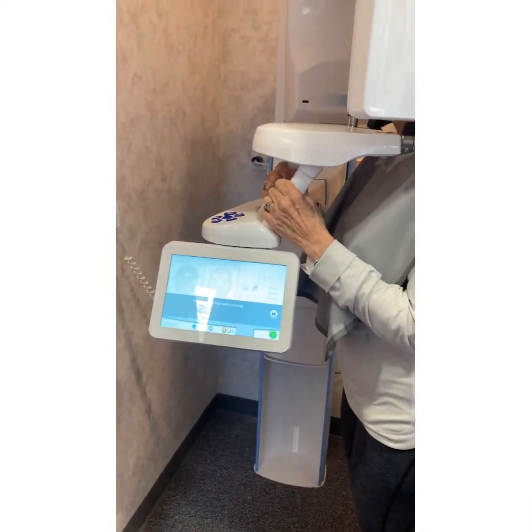Do you recommend scouting every time? Yes, for anything smaller than the jaw, it's a good idea, for sure. Always scout.